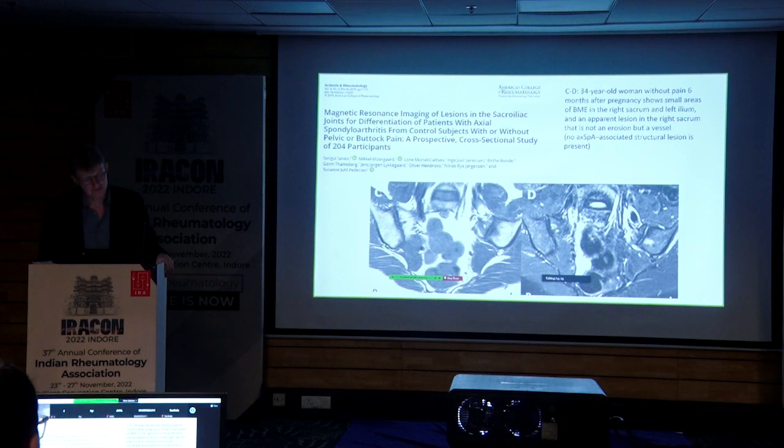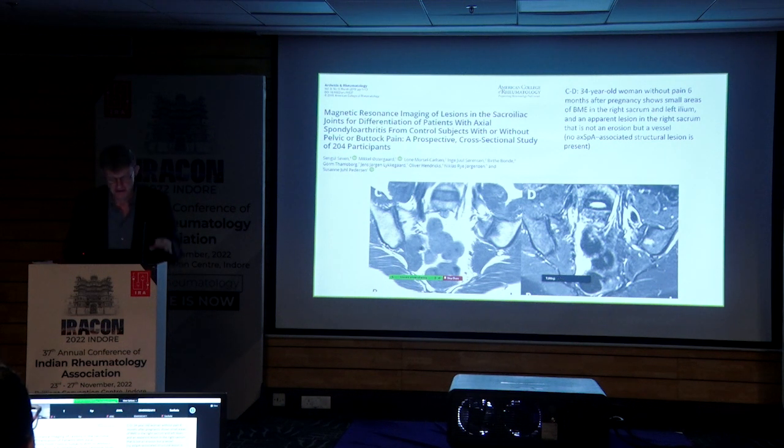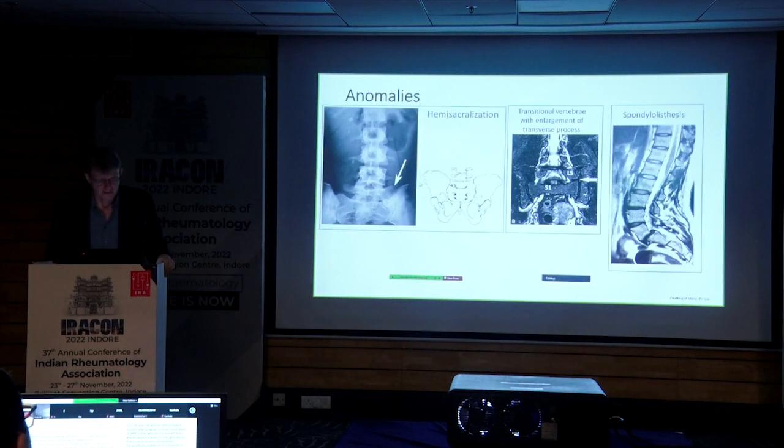But again, be careful with the milder changes in women who has given birth within the last, and I don't know exactly when it goes away, perhaps 1.5 years, something like that. But the sclerosis you can continue having forever. Then there's also anatomical anomalies, and there are various, for instance, here where there is an extra joint between the processus transversus of the L5 and then the S1.